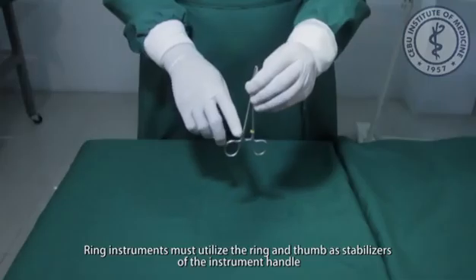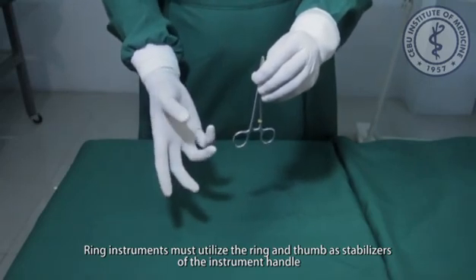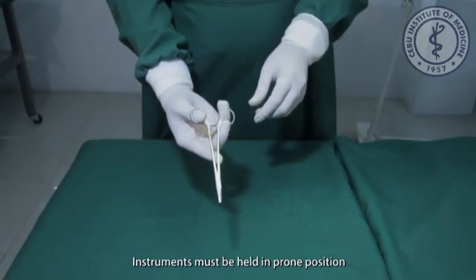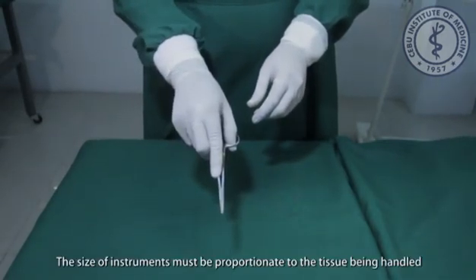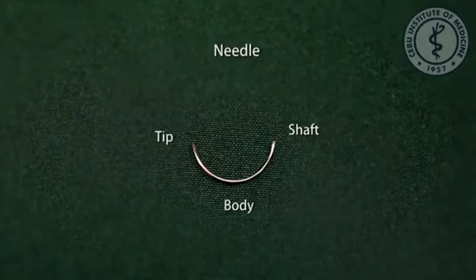Handling of surgical instruments. General guidelines. Ring instruments must utilize the ring finger and thumb as stabilizers of the instrument handle. Instruments must be held in prone position. The size of instruments must be proportionate to the tissue being handled. Needle: shaft, body, tip.